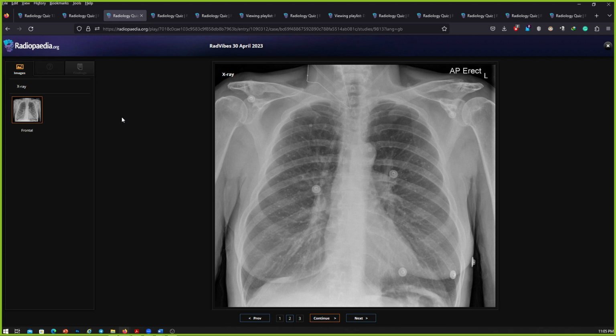Okay, so this is a chest X-ray for a skeletally mature patient, frontal erect view. There are multiple diffuse bilateral well-defined nodules seen in both lung fields with no zonal predilection, and they appear dense, likely calcified, likely representing a previous varicella infection or histoplasmosis infection.